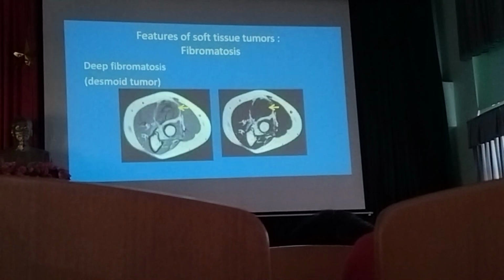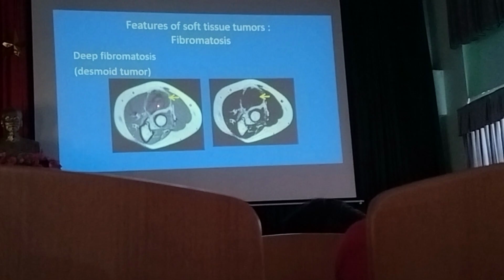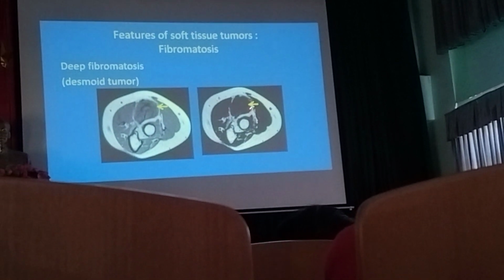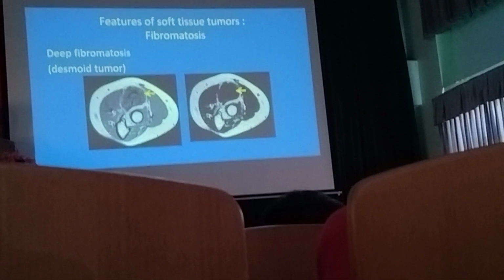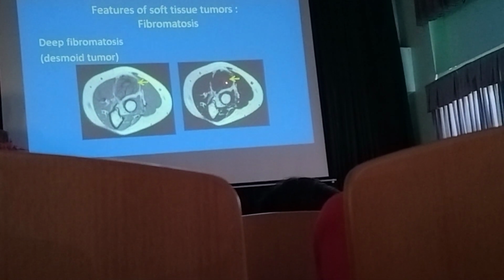Okay, and this is the deep soft tissue which had dark signal on T2 weighted images, so this is deep fibromatosis.